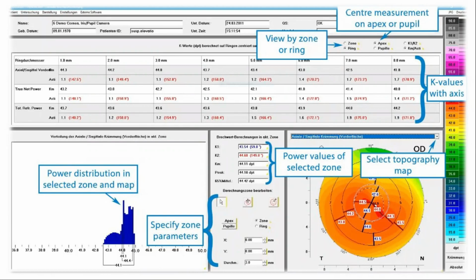Also, I was just thinking, can you tell us a little bit about this map on the left side, the blue map, where the spread is from 43 to 45? How would it be different from a normal cornea to a post-refractive surgery cornea or something else?